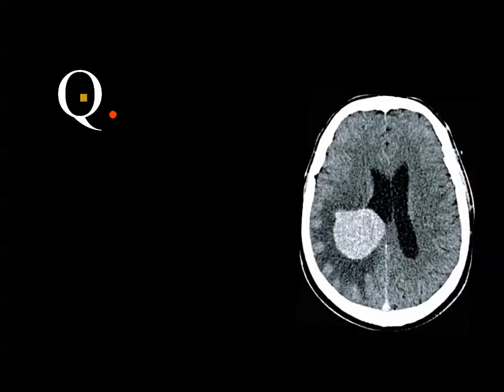The meningioma will occlude the CSF flow from the occipital horn, and it will diffuse around the ventricle. And you know that most of the intraventricular tumors are not associated with edema because they are not touching the brain barrier. And this is not an actual edema.